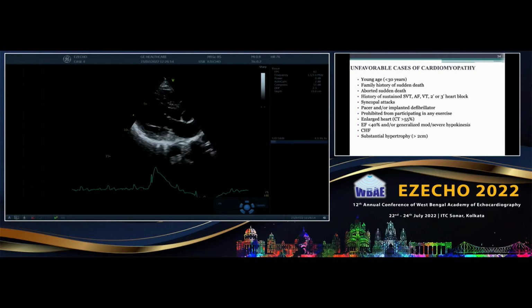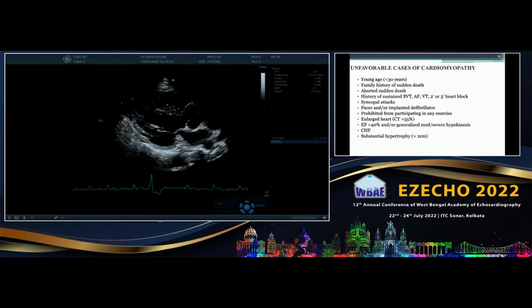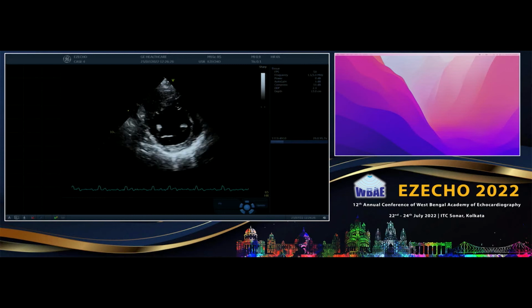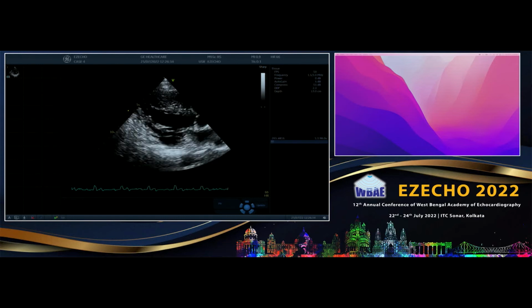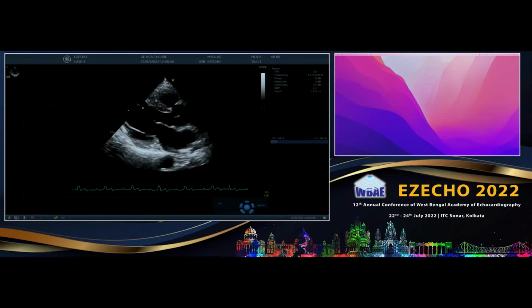In that patient it was very clear. Any history, anything? It is a patient with ischemic heart disease, something. So in the last case, that means we won't get any incremental information in MRI basically. I don't think so. We don't need to do that. Definitely not. Yes, sir. Definitely not, because already you have measured it. Thickness is 30. The ICD decision is done for it.